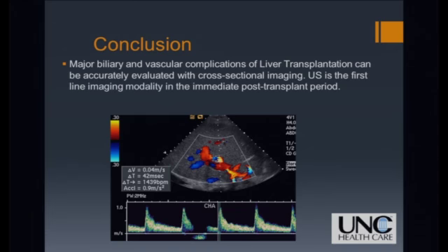In conclusion, major biliary and vascular complications of liver transplantation can be accurately evaluated with cross-sectional imaging. Ultrasound is the first-line imaging modality in the immediate post-transplant period.